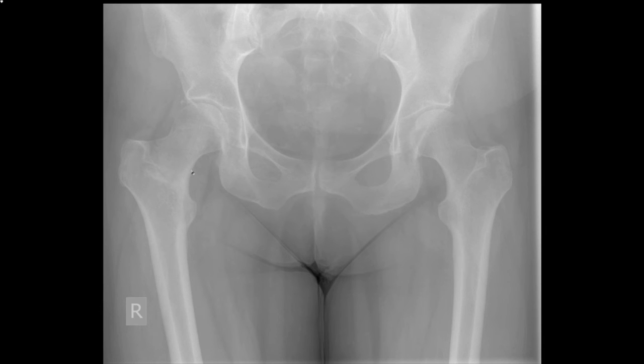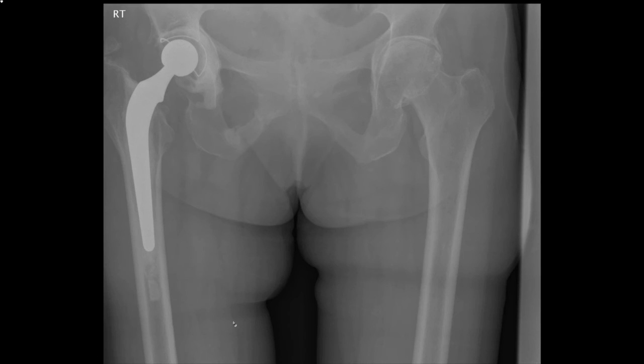The fracture is here, more laterally situated. You can see at the base of the neck, and extends right down the lower aspect of the neck, just superior to the intertrochanteric line. So that's a much more subtle fracture, but indeed would cause symptoms. This lady has previously had her right hip replaced, as you can see.